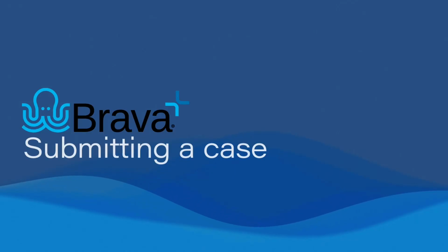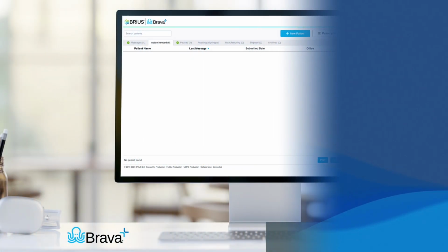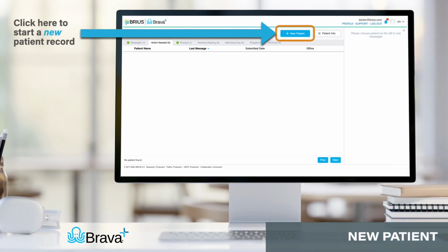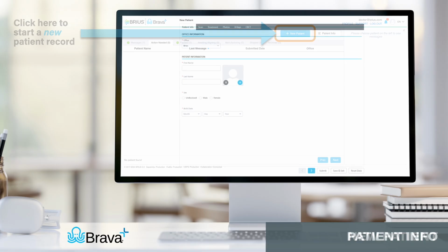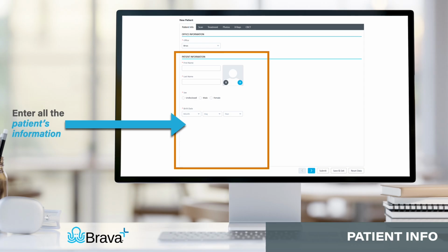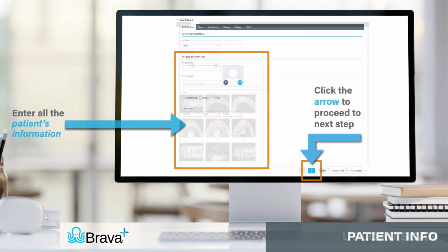In this video, we will review submitting a case in BRIUS Case Planner. To start a new patient in the BRIUS Case Planner, click the blue New Patient button. The New Patient window will open. Enter the patient's first and last name, sex, and date of birth. Once you are finished entering the information, click the blue arrow to go to the next step.